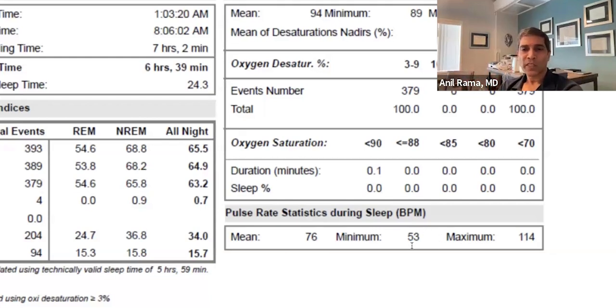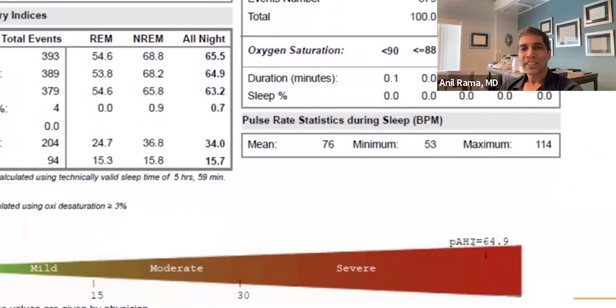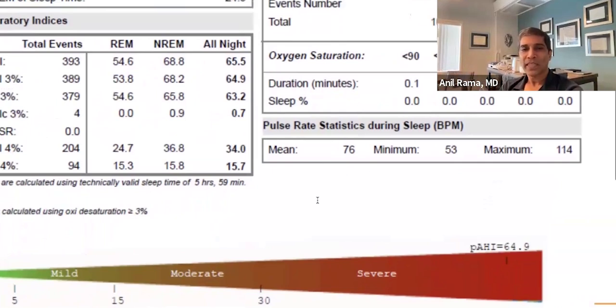So at the surface, you could say, well, this person is elevated. His minimum is 53, not 40, and his maximum is 114, not 90. But the reality is, if the mean is elevated, then both of these numbers will naturally be elevated. So that's interesting. Let's say this gentleman should have been 65. Well, then this would have been 42 and 103. It's still a little elevated, but more in line. But once again, it's a little different. Why is this person's pulse that fast?